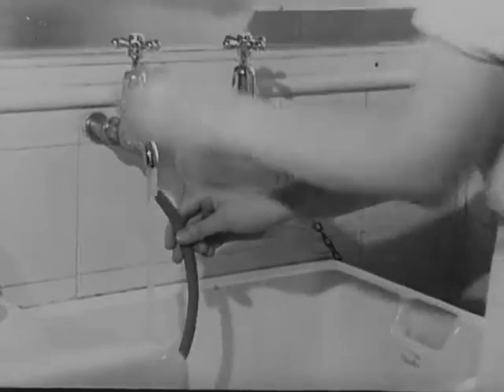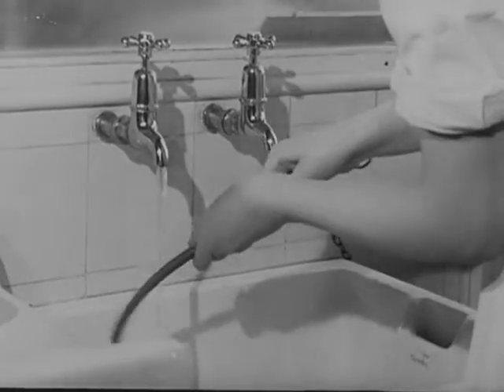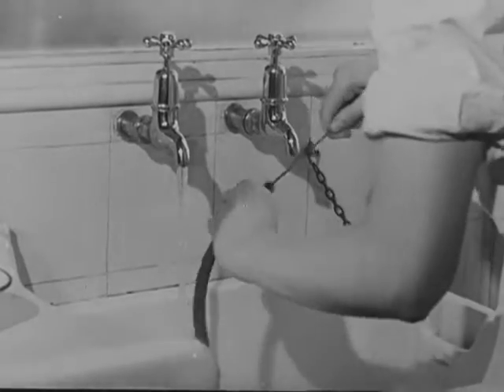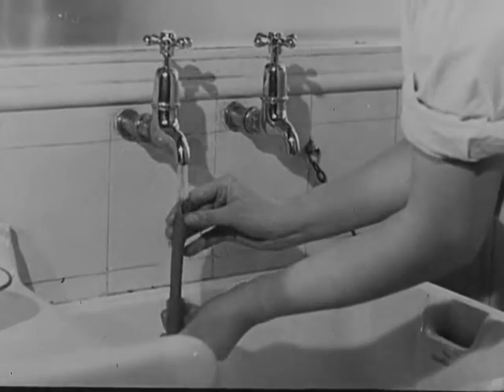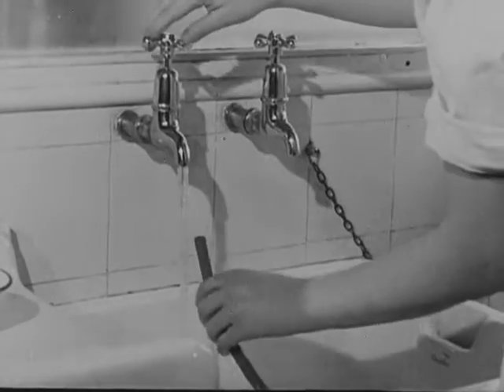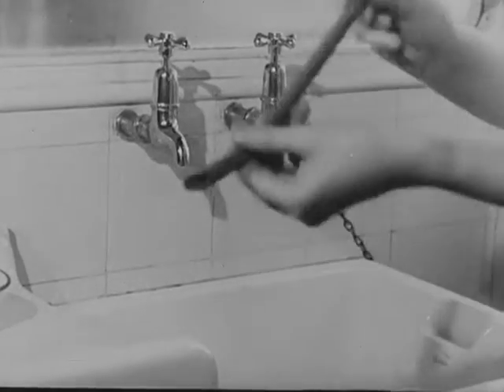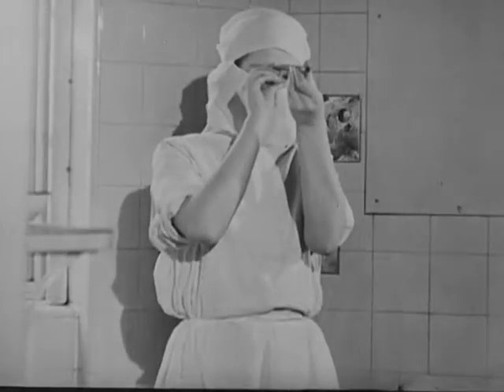Take great care that the inside of the tube is not neglected. Scrub it with a narrow test tube brush and plenty of hot water. Then look through to make sure that no mucus has been left inside.